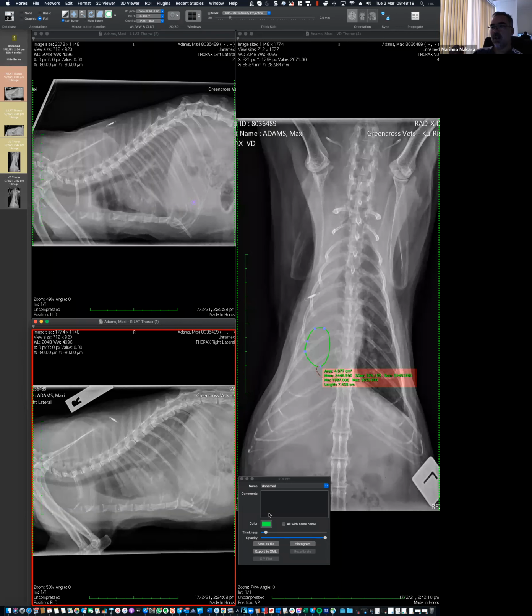And then the other thing that I would add, trying to explain why this is odd, is that remember we are speculating about a mass growing in the airway, and that mass is surrounded by fluid in the lung, or fluid or soft tissue material. It makes sense, either bleeding or atelectasis. So basically, in none of these radiographs do we see the border of that mass. So there is no expectation, because nothing really changes depending on recumbency, to change that. Makes sense?